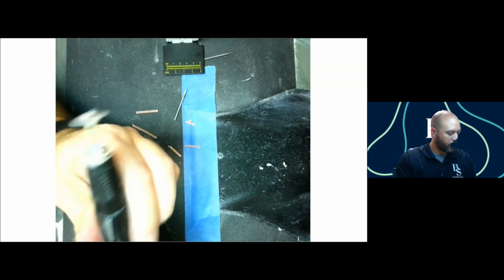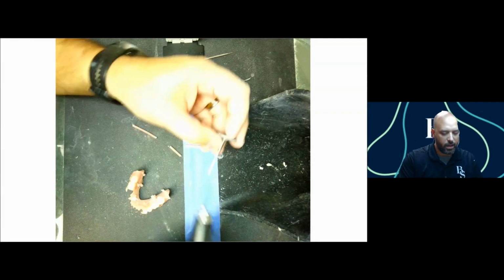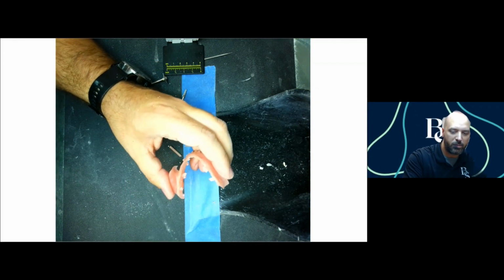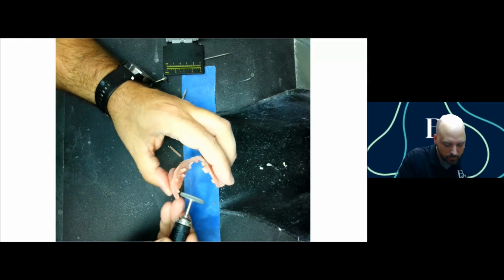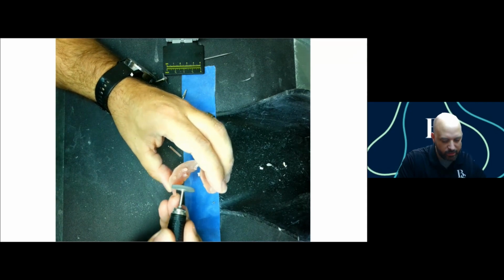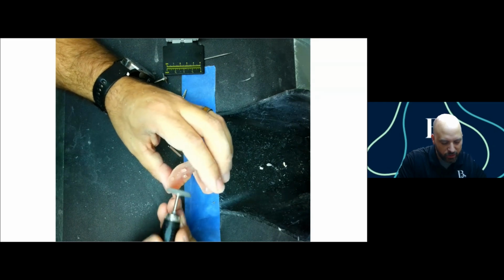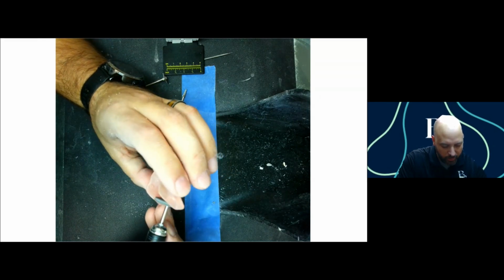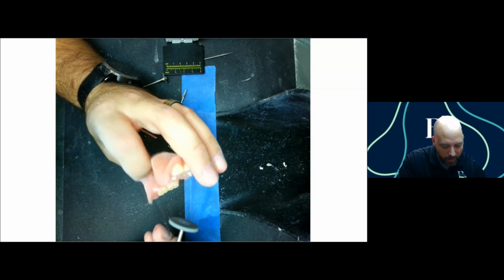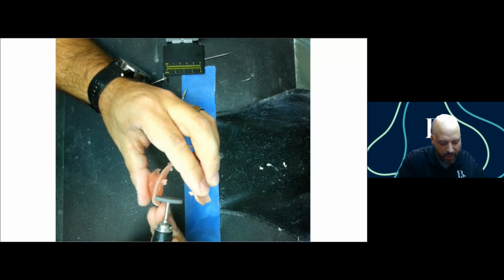So I'm going to switch back to my Wagner wheel. So this guy here. And this is going to let me finish these down the rest of the way. So I'll turn my speed down, and I'll be able to blend these guys really nicely into the base with minimal scratching. And that's just going to help me with the finishing end of it too. So I kind of feel for any ledges or indentations or anything like that as I'm doing this.